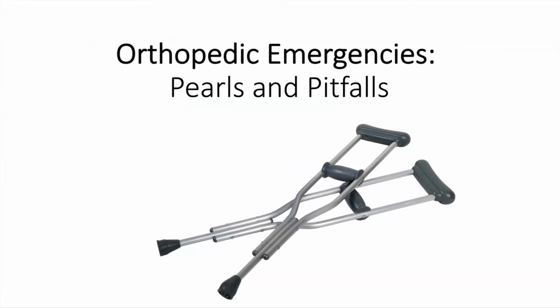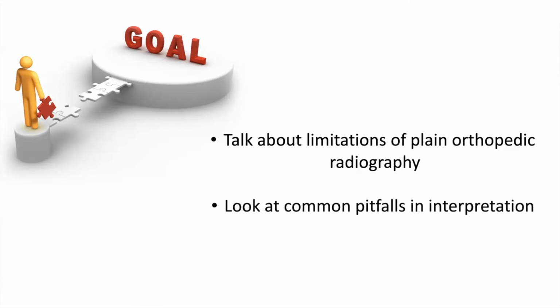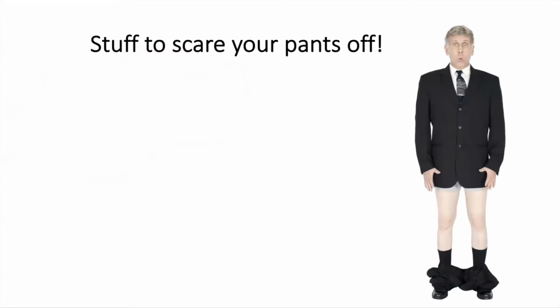So our goals for today, we'll talk about some of the limitations of plain films, particularly in orthopedic radiography. We'll talk about some of the common pitfalls in interpretation, and I want to talk about some of the high-risk orthopedic injuries and their findings. Stuff to scare your pants off. Many of these are serious injuries, and they can have very, very subtle findings.